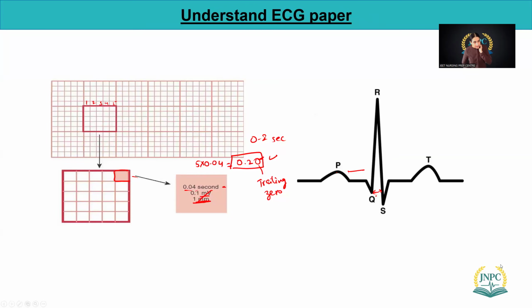If you really look here, we have PQRST, as we already said. P forms when the atriums are depolarizing, then QRS. And if you pay attention here, when Q is forming, there is a slight dip down. I'll tell you later on why we see that slight dip. So when QRS is forming, the ventricles are depolarizing. Depolarizing means the ventricles are contracting, and T forms when the ventricles are relaxing, meaning repolarizing.